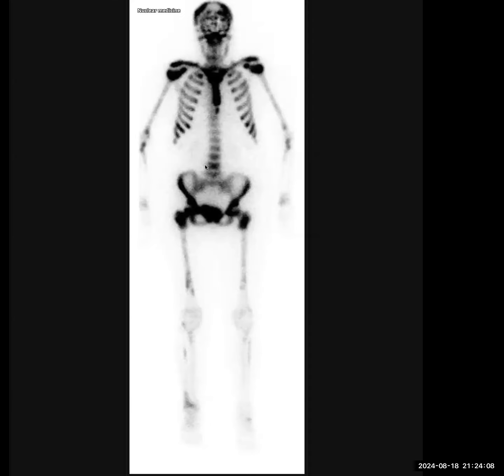This is a super scan. And once you identify the absence of kidney, then the discussion is basically whether you think it's a metabolic superscan or whether it's a metastatic superscan. In this particular case, because the distribution is predominantly in the axial skeleton and the very proximal appendicular skeleton, this is a metastatic superscan.